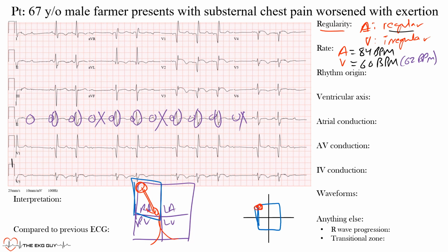Here's our sinus node. Conduction's heading in this direction. Here's lead 1, AVF, lead 2, AVR, and then we have our horizontal plane, V4, V5, and V6. If the wave is heading in that direction, we should see upright P waves in those leads in sinus rhythm, if it's coming from the sinus node, and inverted in AVR.